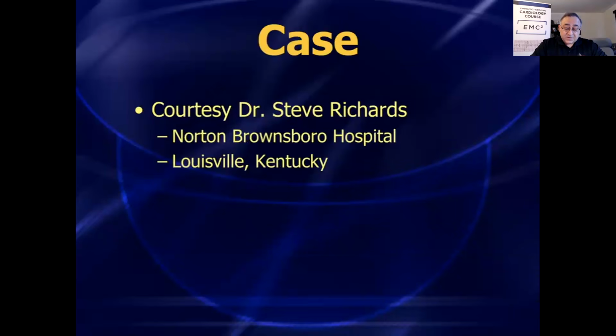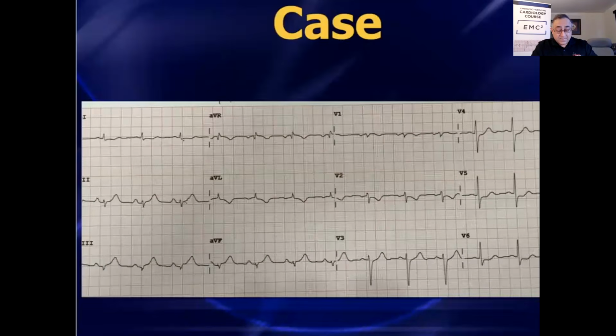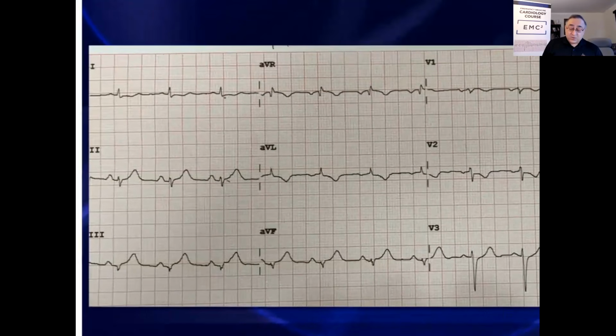All right. Here's a case from Kentucky, 71-year-old, chest pressure, diaphoresis. There's a bad word, diaphoresis. And on this case, what do you see? Well, number one, hopefully you're noticing that there's a flip T wave in aVL. I don't know if it's new or old, but it's worth rechecking.